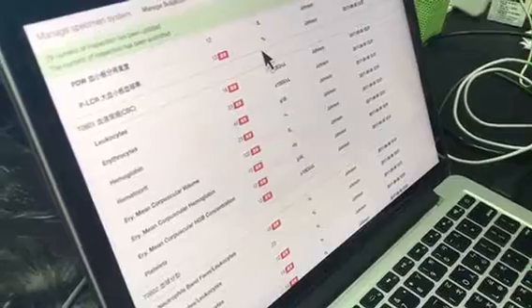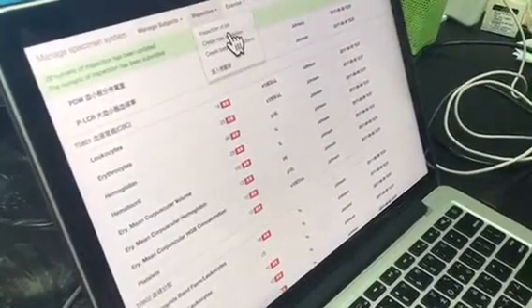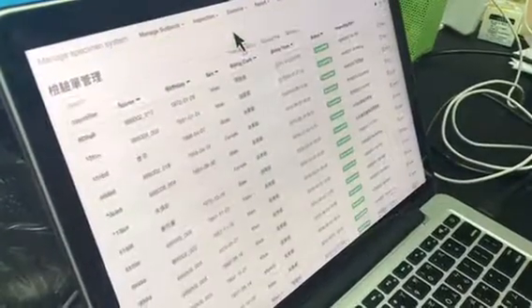Okay, so let's continue. Once we get the result, we are going to print out the report. So let's come to the report. Let's find this tube, and down here you see there's an output report.